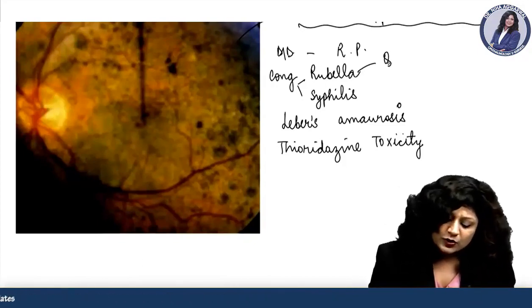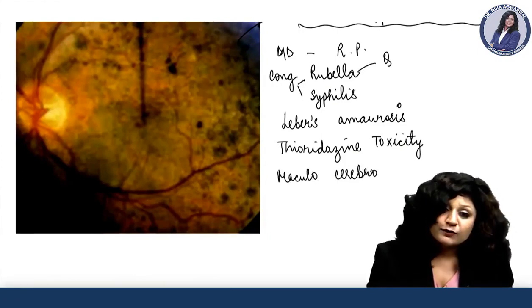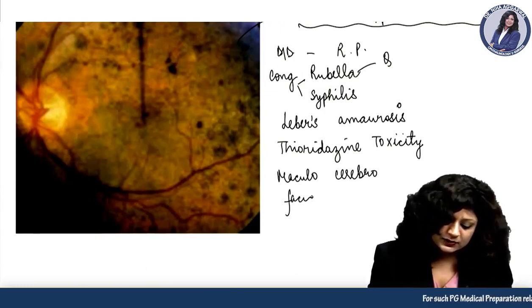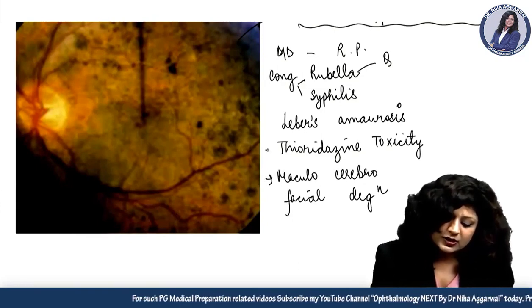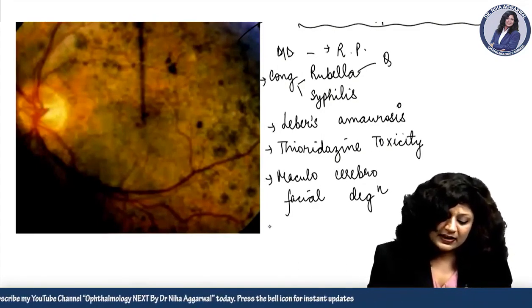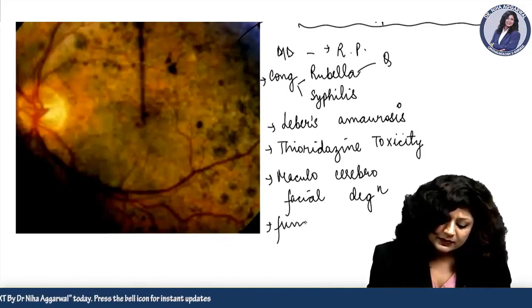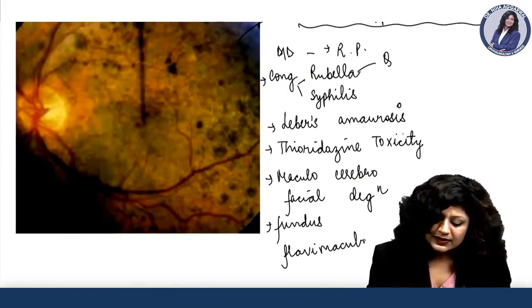Then we also have maculocerebrofacial degeneration. Facial degeneration, this is another important cause of salt and pepper retinitis. Then we have fundus flavimaculatus.